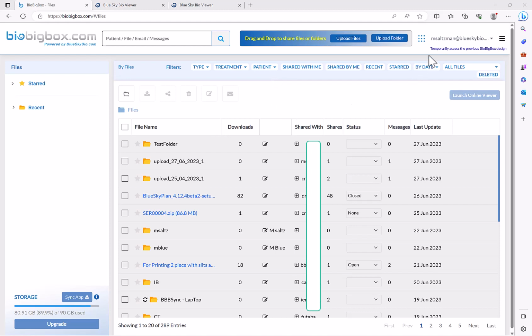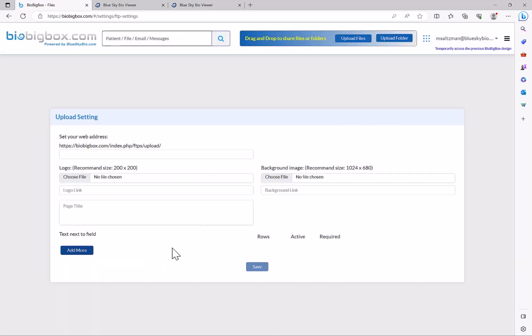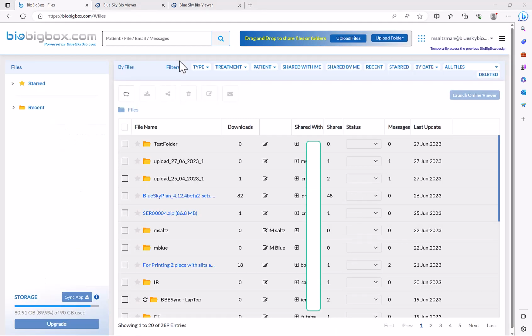We do have the ability for a lab or a clinician to build their own customized upload page. You could then share the link with the relevant people. They could upload their data directly to your customized and branded upload page, and it will show up in your BioBigBox account. That's a topic for an additional video, but for the enterprise accounts, we do have upload settings where you could go ahead and customize your upload page with your own branding and your own text and everything else. And then, as I mentioned, other dentists or users or customers will be able to upload data directly to your branded upload page, and it will show up directly in your BioBigBox account.